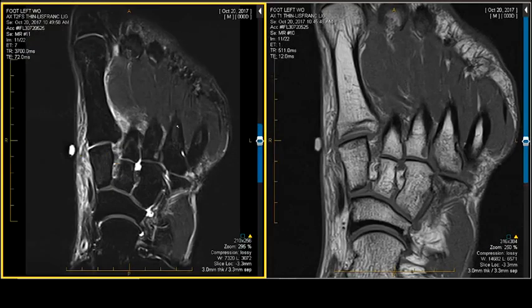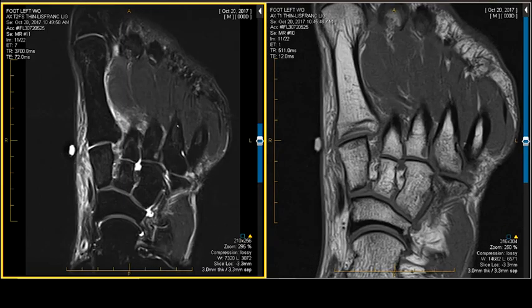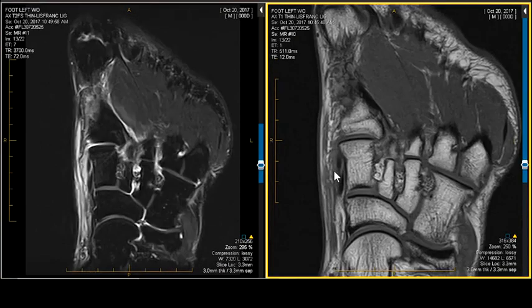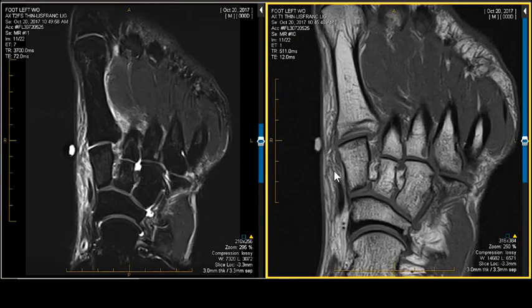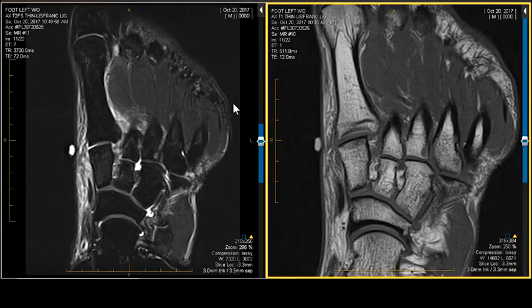Let's keep going, shall we? This looks like a pretty serious injury. So the main ligament is gone. Fortunately, we don't have splaying, so-called divergence of these columns from these columns. That's the divergent type. And fortunately, they don't all migrate to one side, the convergent type.